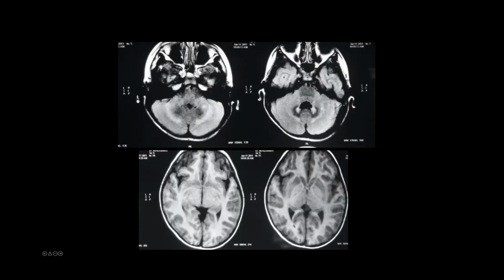The axial images again, the FLAIR images, you can appreciate the typical pattern of appearance of the dentate nuclei and the cerebellar white matter. The volume is relatively spared as compared to the index case.